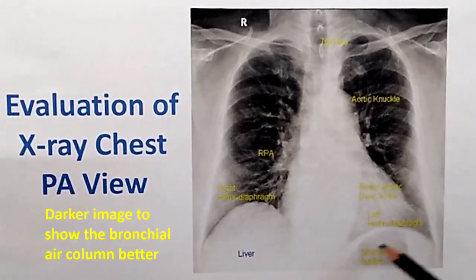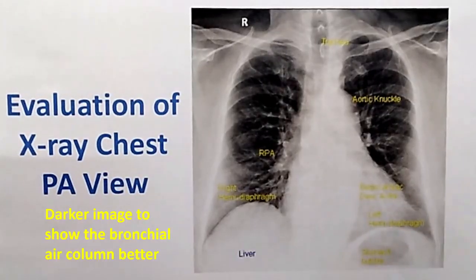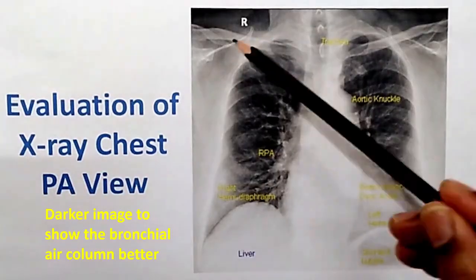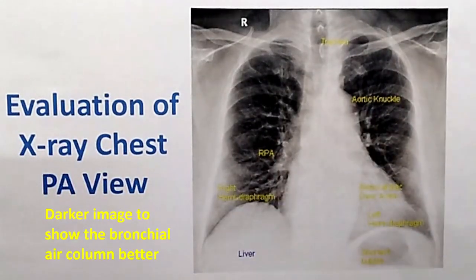You can identify the erect posture by looking at the stomach air bubble, which will show an air bubble below the diaphragm, left hemi-diaphragm normally. And when you go by a sequence, you look at the bony cage and soft tissues first before looking at what you're seeing obviously.